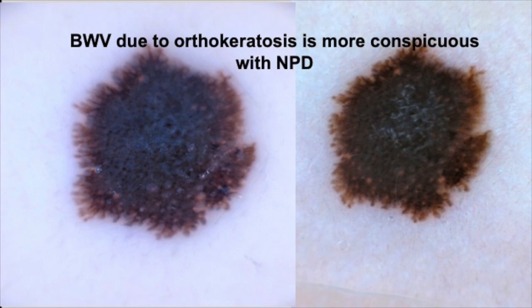Next, I know that there is something occurring in the stroma as well. So this is going to have something beyond just at the DE junction, right? So yes, there'll be confluent junctional nests of melanocytes, the radial growth phase, but in addition, there'll be something that's occurring in the dermis as well. So you can see a lot of information that you can gather when you look at polarized, non-polarized light and you put the pieces together.